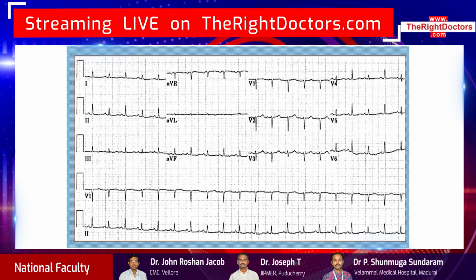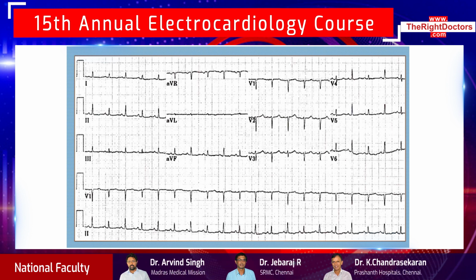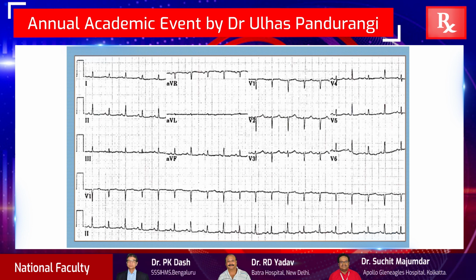So the striking feature straight away is sinus tachycardia. In addition, you can see alteration in the voltage of complexes. So electrical alternans. And obviously there are low voltage complexes. In aVL, you barely see any voltage.